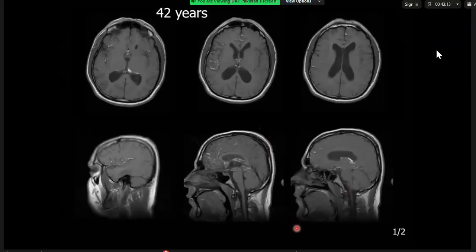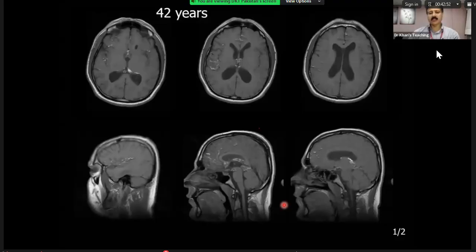So I can see there's a disease pattern that mainly involves, so it's going through the gyri, and it's a gyriform pattern, a high intensity. Let me give you a hint. It's sitting in the subarachnoid spaces.